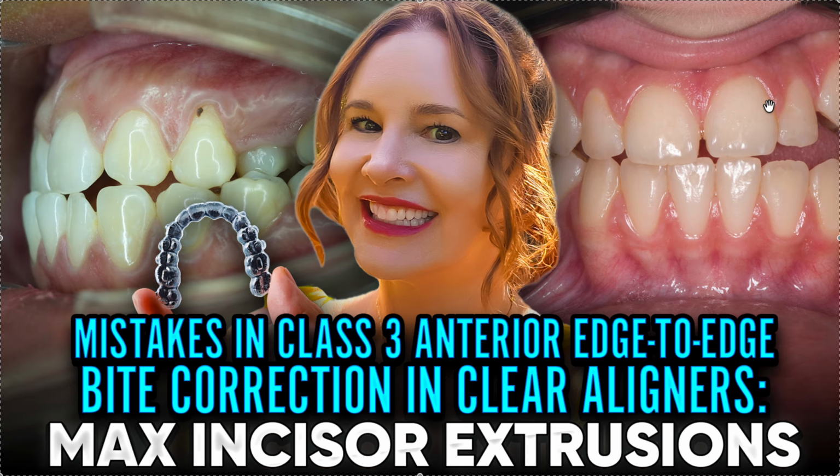Oh my goodness, I'm looking at them. I don't even have to know. I click on them and I can tell that's an AI bot engine that did this. So junk. Sorry, a little bit of my dialect came out. I'm very frustrated about this.